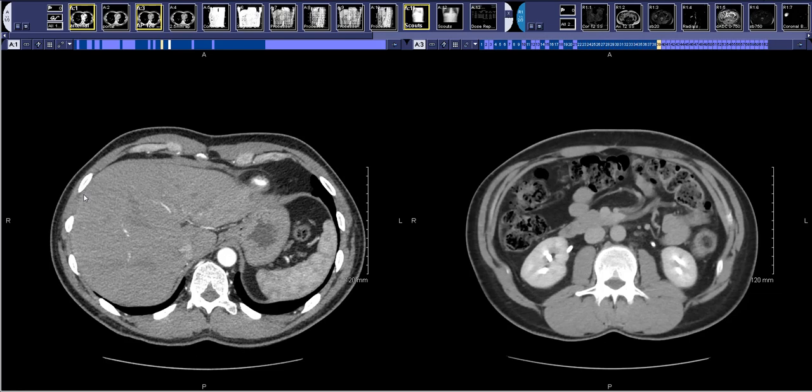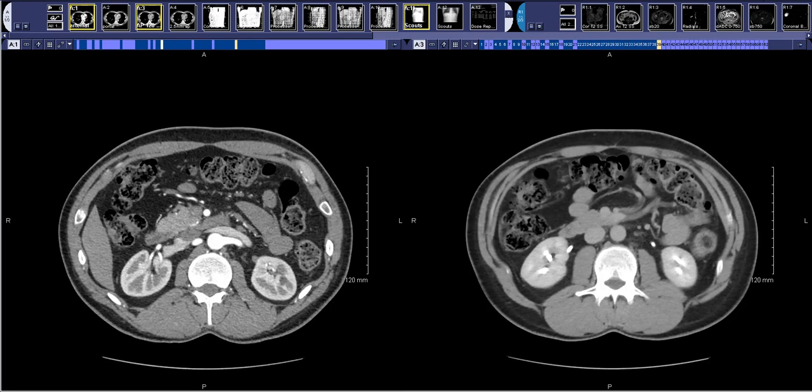We do a multiphasic study here consisting of arterial, venous, and delayed phase scanning. Some places will add in a non-contrast scan to look at stones, because if you have a heavy stone burden, that's a relative contraindication for donating your kidney. Here we found that on the arterial phase, you can usually make out kidney stones if they're of significant size and number, so we elect to spare the patient radiation and actually do not do a non-contrast scan.